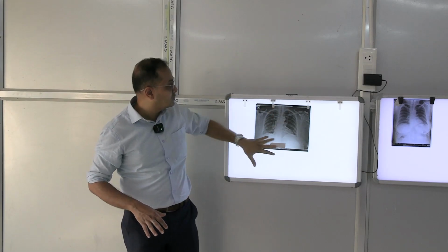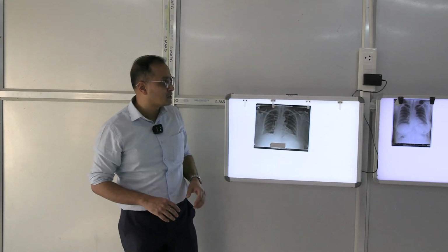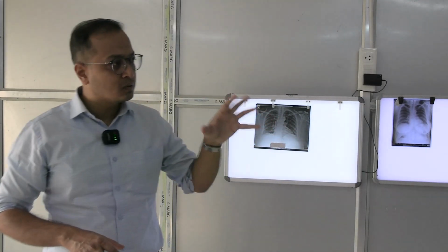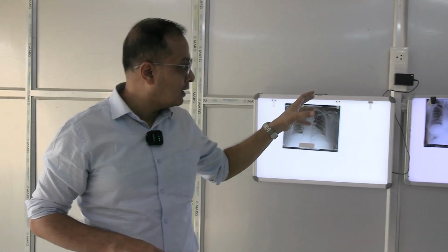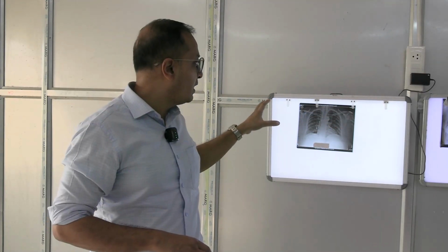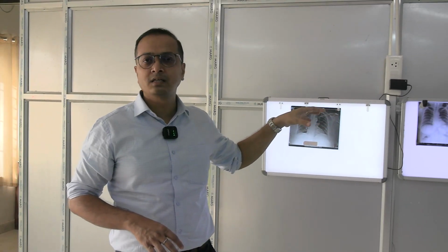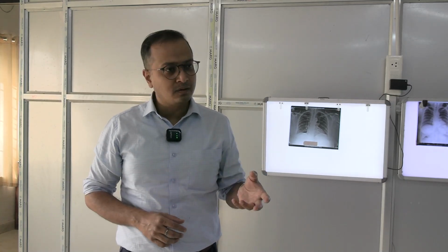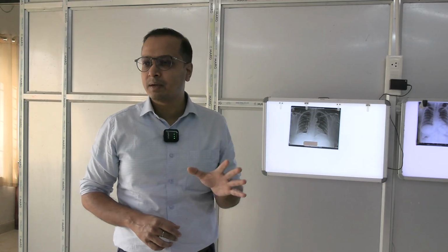So these soft tissue structures in this thorax you have to identify. Individually break down into smaller groups, split into 4 small groups, and identify the structures in each of these sciagram plates, 4 of them. Starting with the first thing: whether this plate is a general plate or a plain X-ray or a special X-ray. Then you have to identify the view of the X-ray, whether you can understand the view which is present in the thorax.